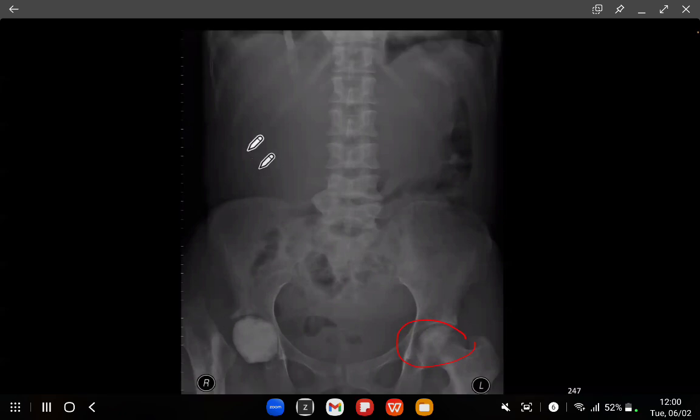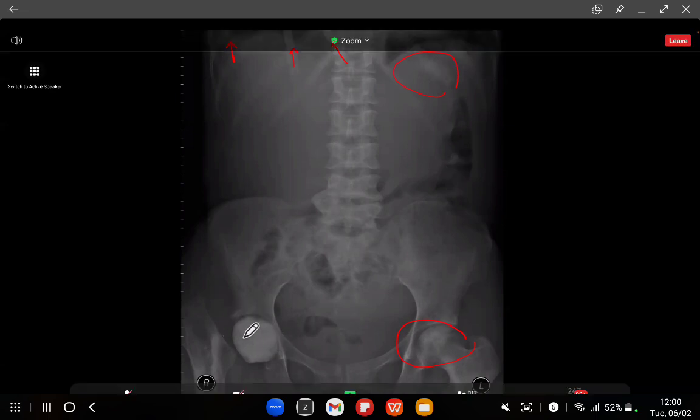You'll also notice there's a right pleural effusion there, and what looks like a double lumen neckline. So we've got one limb there: double lumen neckline, right pleural effusion, small spleen which is calcified, avascular necrosis. That hip replacement is probably for avascular necrosis also. And then we've got H-shaped vertebrae. So a very nice demonstration of sickle cell disease.